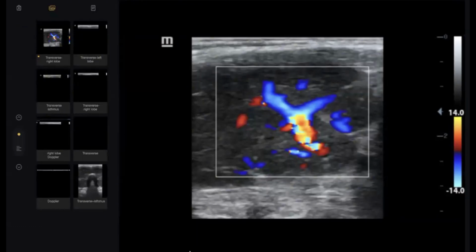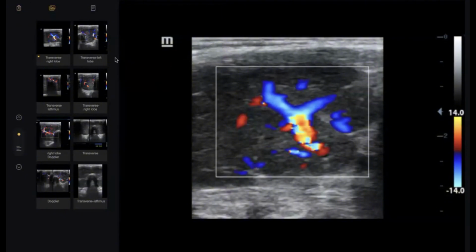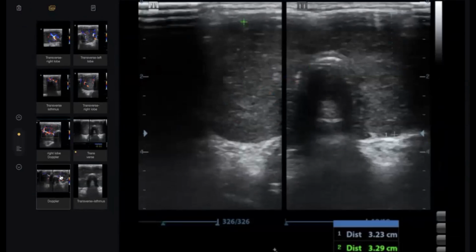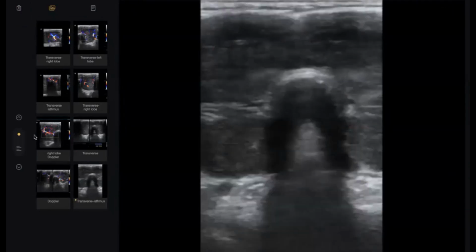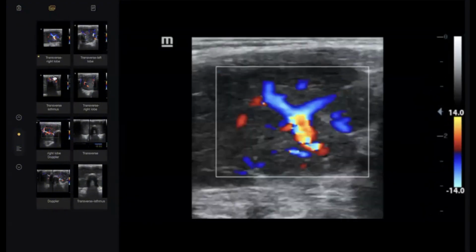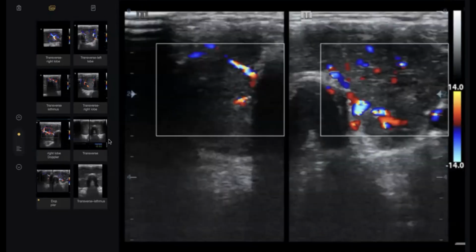Dr. Nagam, did we finish our 15 candidates? Yes, sir. Come, Dr. Nagam, because I want you to finish your case. A 40-year-old female patient presented with weight loss and palpitation. I am presented with an ultrasound for a 50-year-old patient with weight loss. This is the thyroid. It shows gross enlargement with inhomogeneous appearance and increased vascularity. No discrete nodules. So my differential up to this point is thyroiditis.